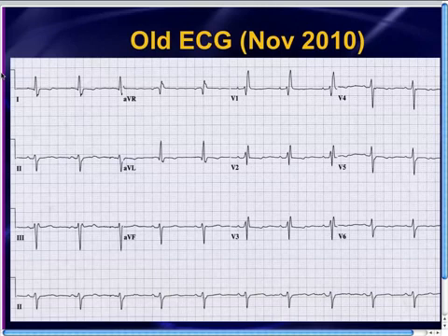We'll come back to that thought in just a second. Well, we got some more information beyond just looking at her EKG. We got an old EKG, and this is also very, very important. Probably not done often enough. But whenever you're scratching your head about an EKG, take an extra 5 minutes and get the old EKG.